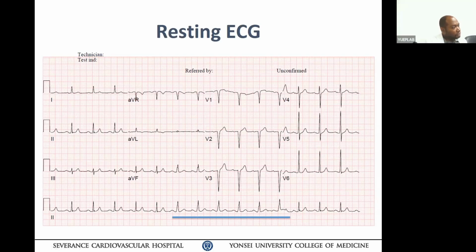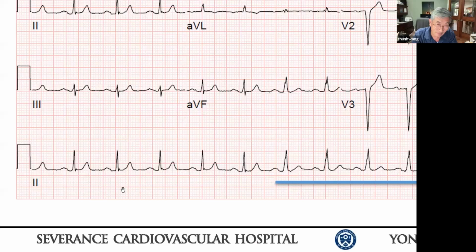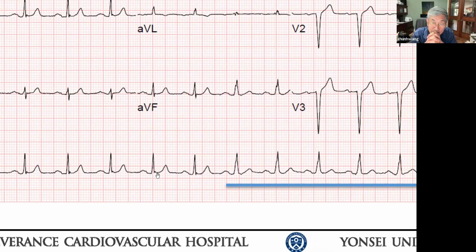Did you see the small tiny Q? Yes, there is. I'm not imagining, okay? So it is important to see these things. Look at that gradually disappear.